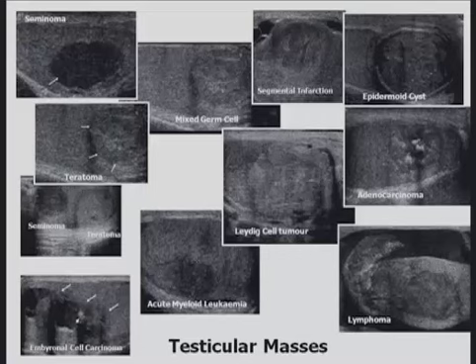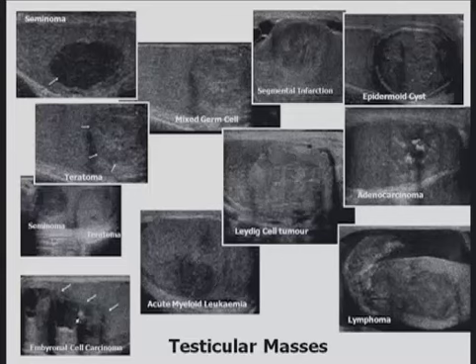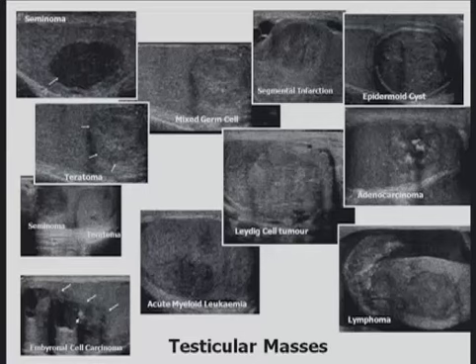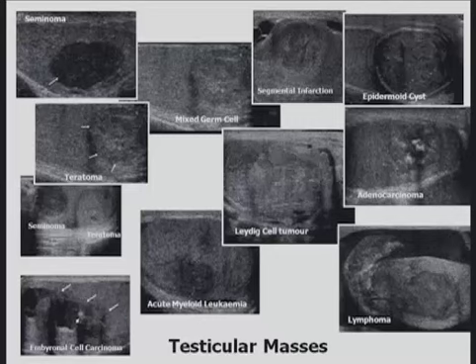On ultrasound, these lesions may take many forms. The classical seminoma is known to all of you as that low reflective, well circumscribed abnormality within the testes. A teratoma, which contains many different cell types, will look very different with areas of calcification and mixed echogenicity. However, these germ cells all require an orchidectomy.